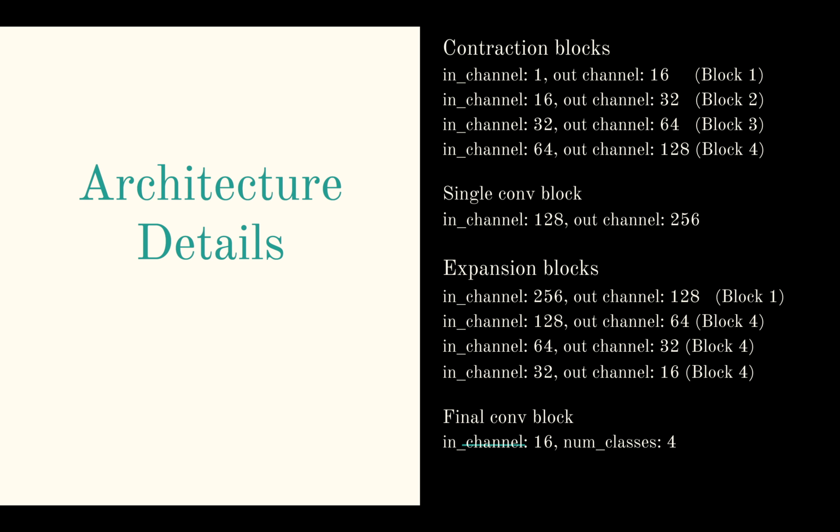This model was trained for 56 epochs with a batch size of 8. I used cross-entropy loss function and Adam as the optimizer with the learning rate of 0.0002. I chose accuracy and dice score as the evaluation metrics for this task. Let's see some of the results.